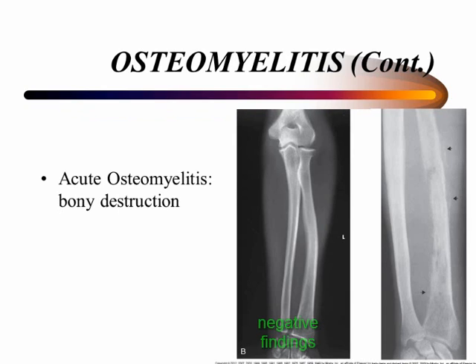On plain radiographs, the earliest evidence of osteomyelitis in a long bone is localized deep soft tissue swelling adjacent to the metaphysis. The initial bone changes appear as subtle areas of metaphyseal lucency, reflecting resorption of necrotic bone. Soon, bone destruction becomes more prominent, producing a ragged, moth-eaten appearance.